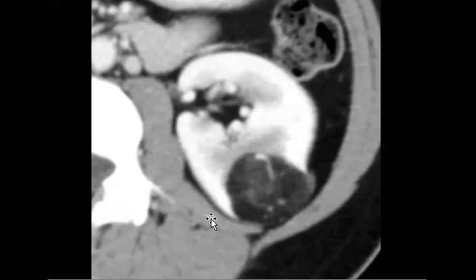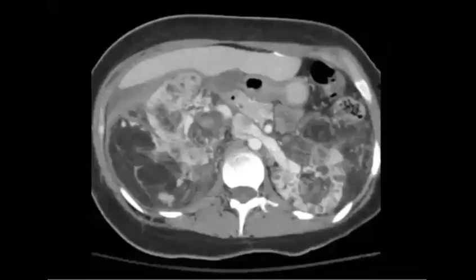Okay. Nermeen, yes. Welcome back. So what do you see here? And what is your description? Why tuberous? Multiple bilateral AML. Perfect. Multiple bilateral AML.